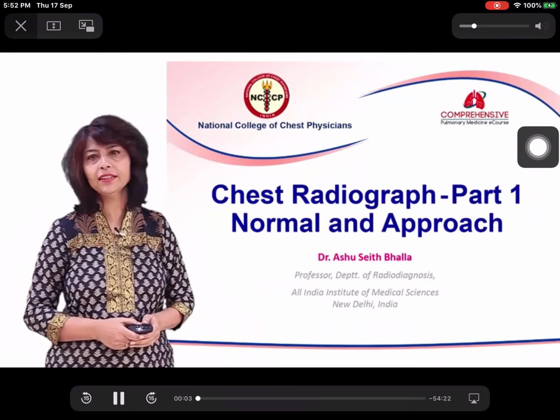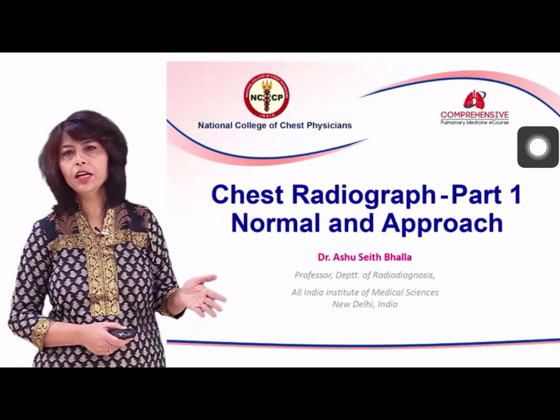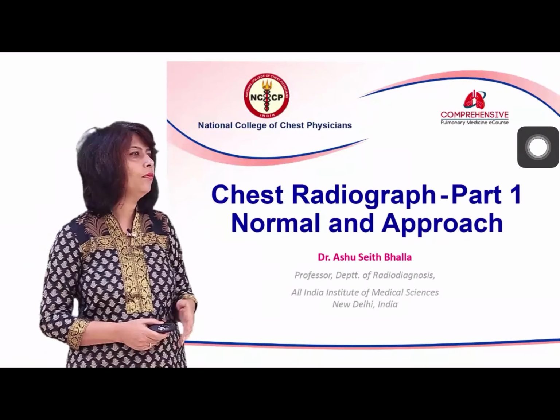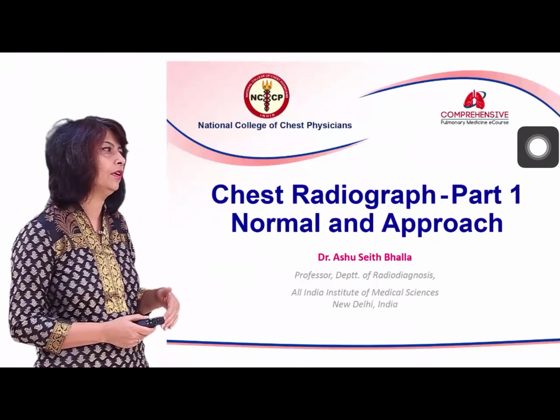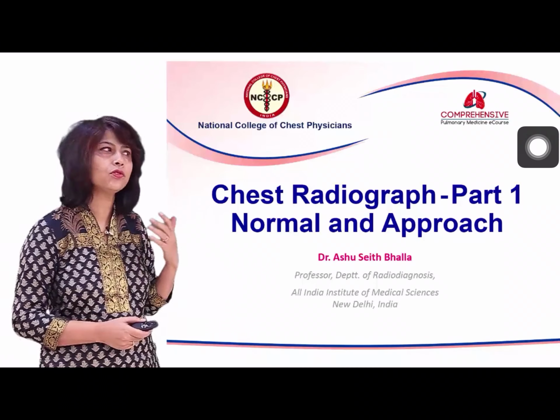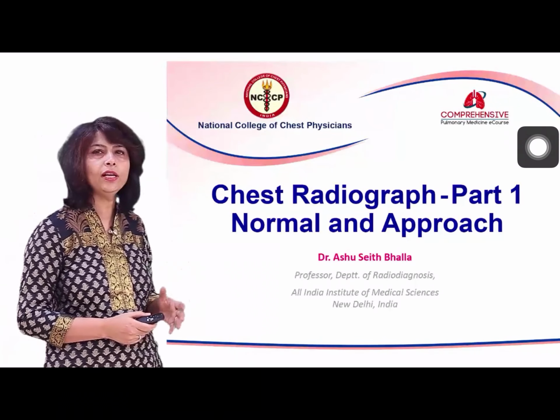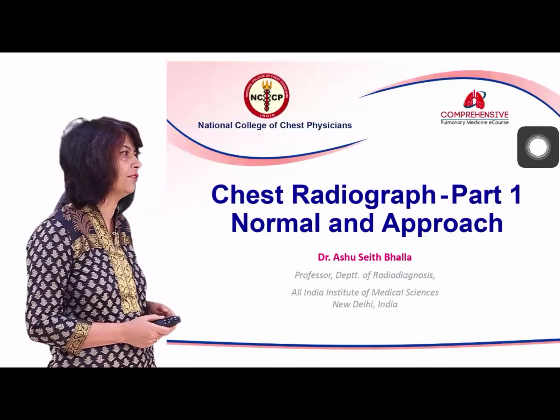The simplest but also the most important part of thoracic radiology, which is interpretation of a chest radiograph. We've divided this talk into two parts. Part one will cover more of normal and how to proceed on reading a chest radiograph, while the second will explain more details about interpretation specifically.